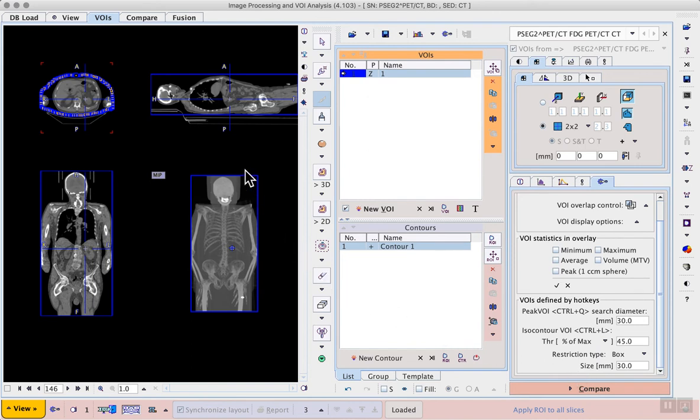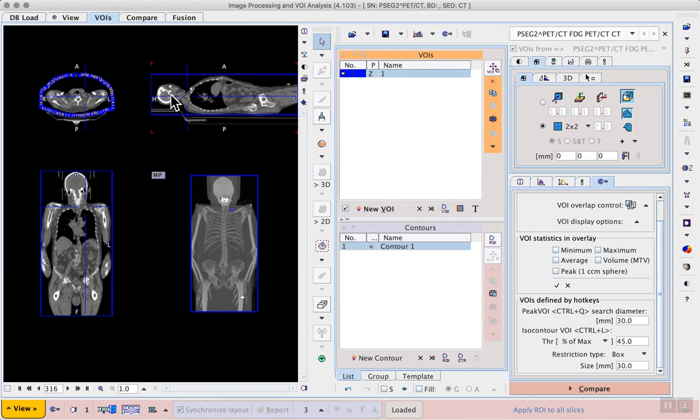After a short calculation, we now see that our ROI has been copied to all of the axial slices in the image, meaning that we can use this for masking of the whole body. If we return to the VOI's neutral mode, the cursor at the top of the tools, then we can navigate through the image to see how our contour corresponds to the outline of the body.